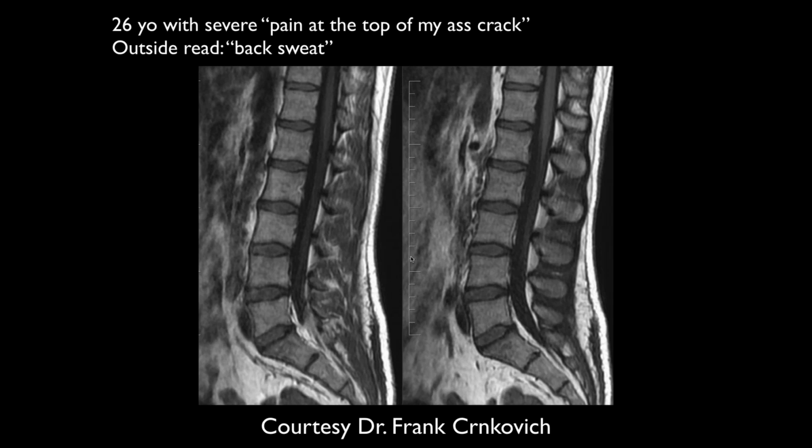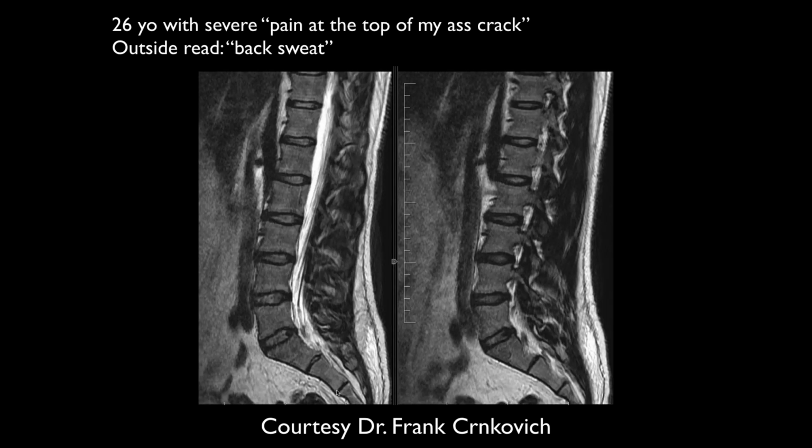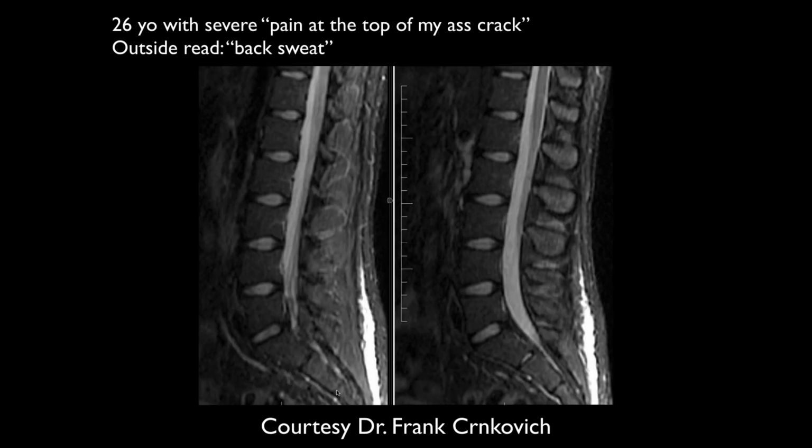So we have a T1. So it'll be a little colorful today. I guess there's a little bit of marrow replacement at S1. Not sure if that's real or, yeah. And, yeah, there's edema in the subcutaneous soft tissues.